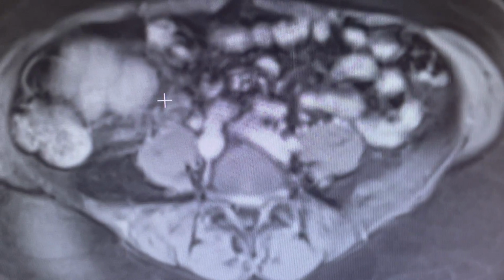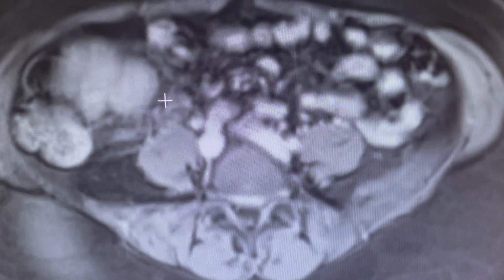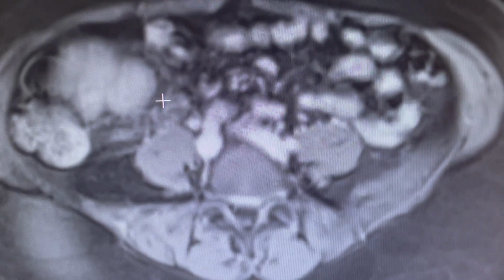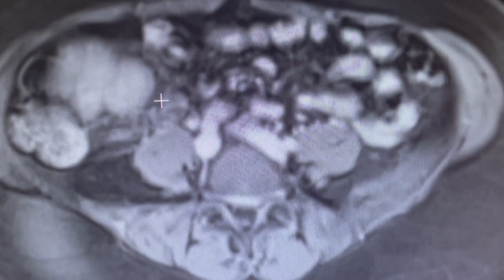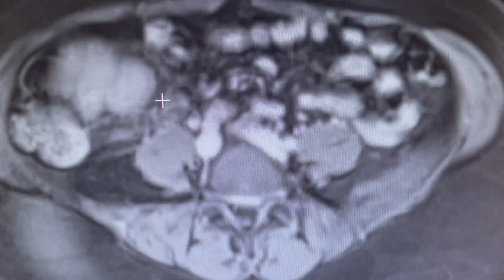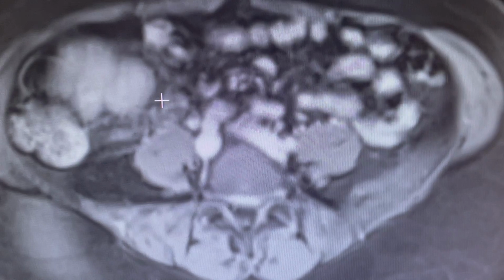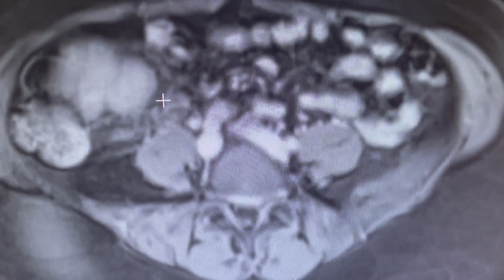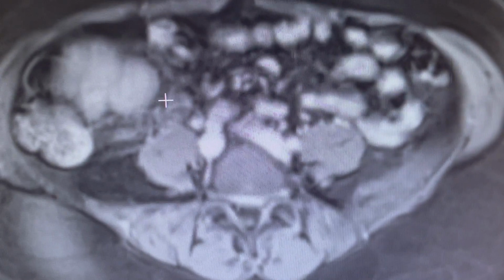These did not. So that leaves us with the highest likelihood for the larger lesions being hemangiomas, but the enhancement's somewhat unusual. So maybe these are capillary hemangiomas or some hemangioma variant, like littoral cell angiomas, for instance. Now, the small multitude of tiny lesions may represent FNHs or family members of that category, various hyperplastic lesions.